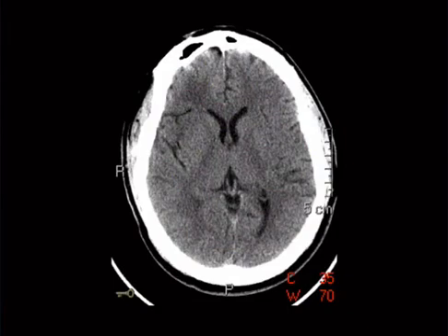You see anything? No, me neither. So showing this case to remind you that none of the above is sometimes an option on the test. It's possible for an answer choice to be normal, which is the radiology equivalent of none of the above, which for me is like the hardest question, really unnerving. But I'm going to give you some strategy or some things to put in your mind with regard to this.